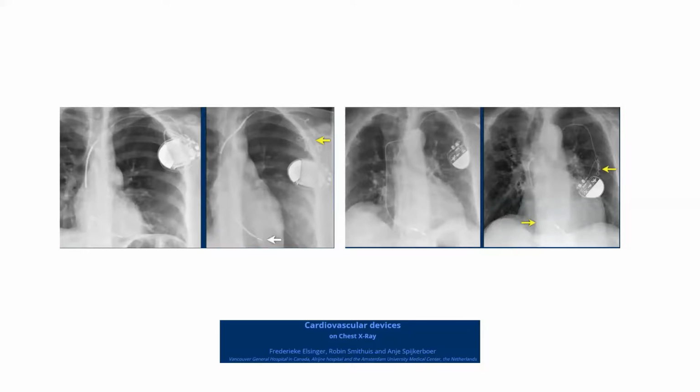So if a patient after a pacemaker implantation comes to you complaining of abdominal pulsation, and you see his tummy pulsating, that means this is phrenic nerve stimulation because of a detached RV lead. Twiddler syndrome. Okay, so remember this one.